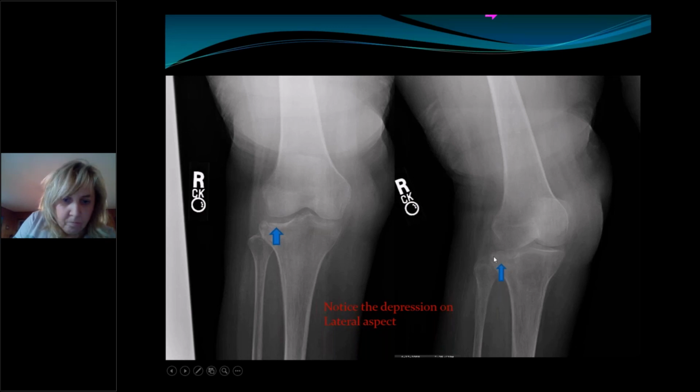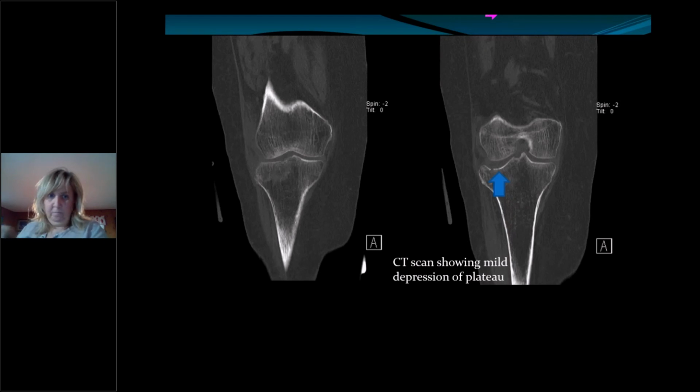So this is a patient who actually had a tibial plateau fracture, specifically a lateral tibial plateau fracture. And we got a CT of this because the question in the head was, if there's no displacement and you put them in a knee immobilizer, non-weight bearing, they could probably do well and be managed conservatively. However, if there's significant displacement, then they really require operative management. Otherwise, they're going to end up with a horrible, osteoarthritic joint. So this person actually did very well. There was minimal to no displacement, so they were placed in a knee immobilizer, non-weight bearing status, and they did reasonably well.